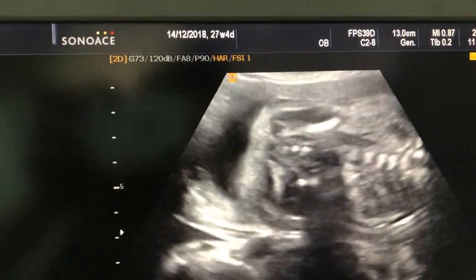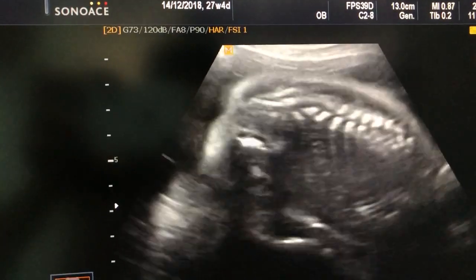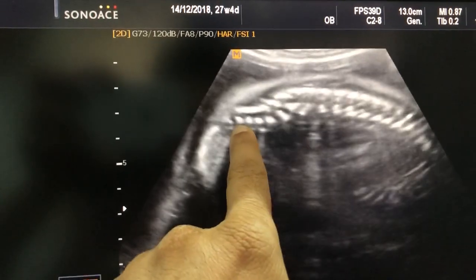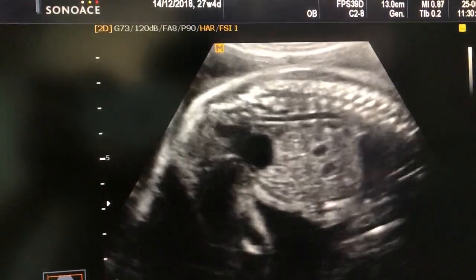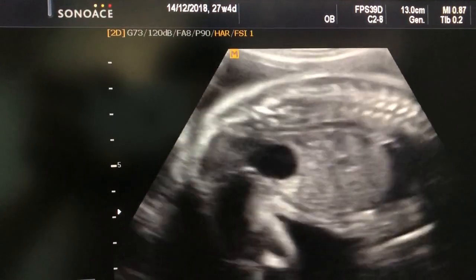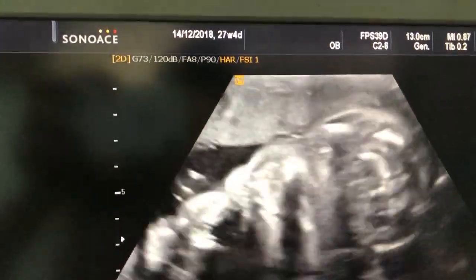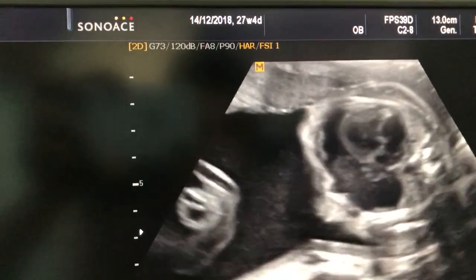So this is a case of spina bifida, no herniation of the spinal cord or the meninges, and this is the mid sagittal plane. There is tapering also, so you have to look very meticulously in this type of case, otherwise there is high chance to miss, and there is associated left side pleural effusion also.